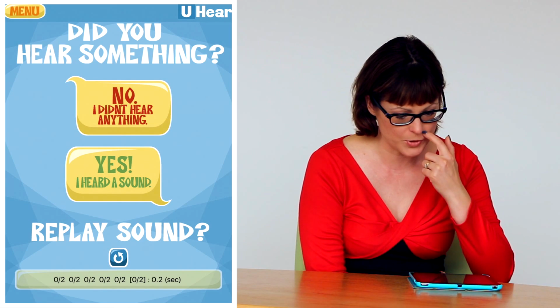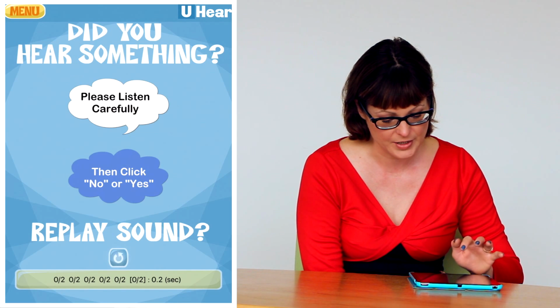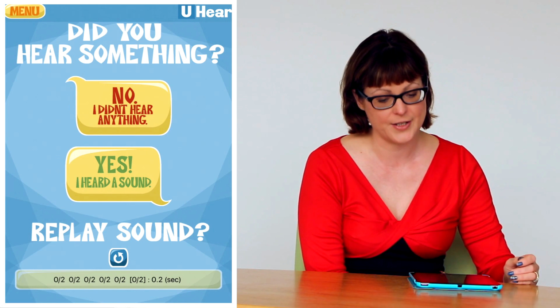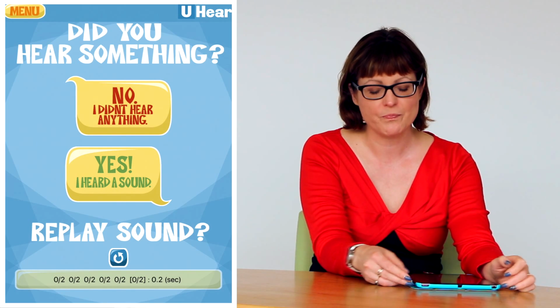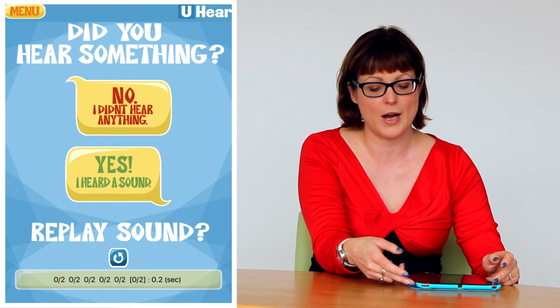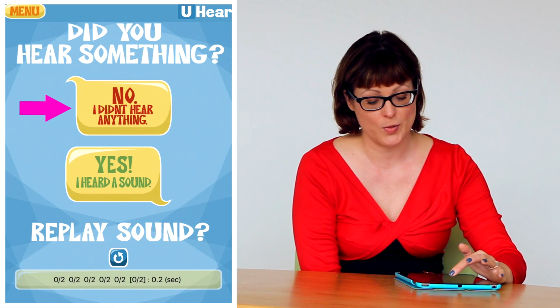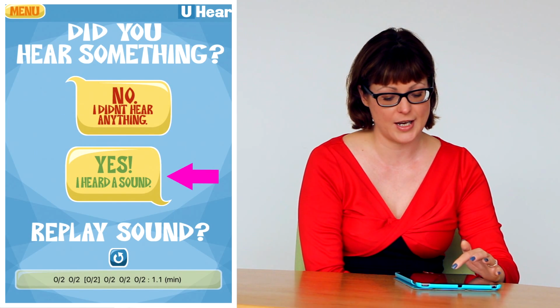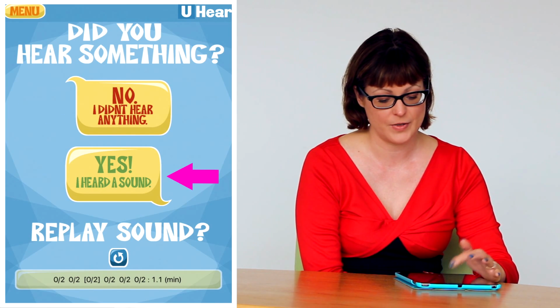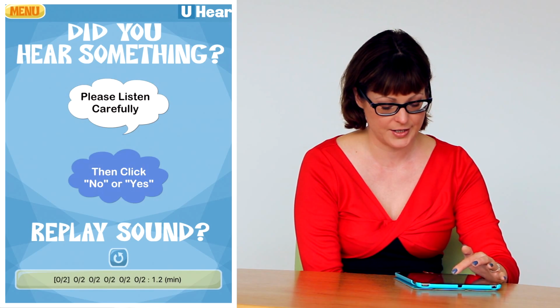And you'll notice what popped up very, very quickly there. So we knew a tone had been played. Please listen carefully, then click no or yes. So you will have headphones on for this app, and we suggest setting the volume at about the halfway point. If you didn't hear anything, you just tap on no, I didn't hear anything. If you did hear something, you say yes, I heard a sound. And that's it. I'm just going to click my way through the test.